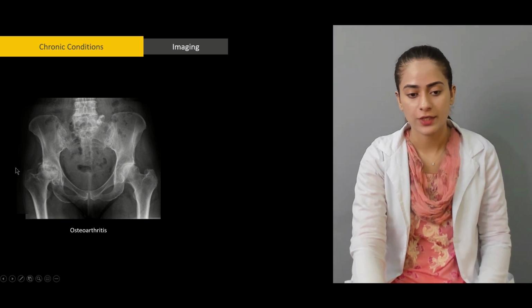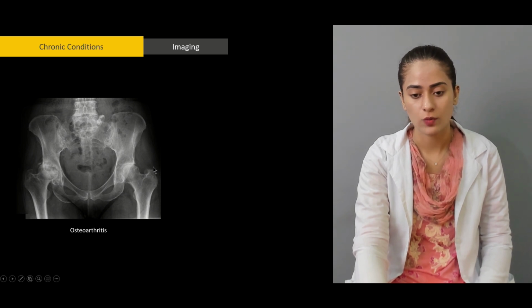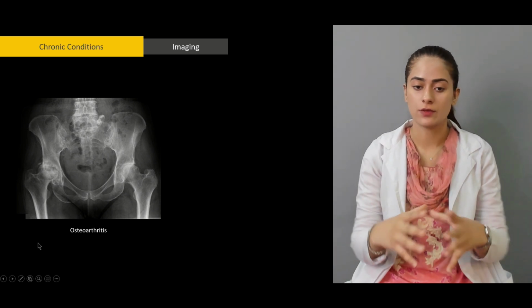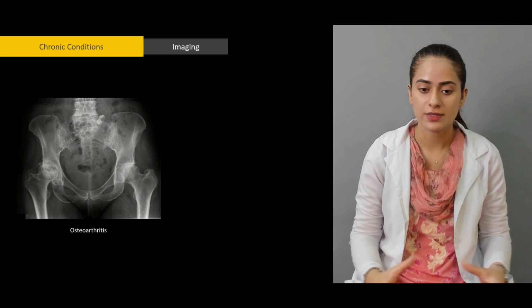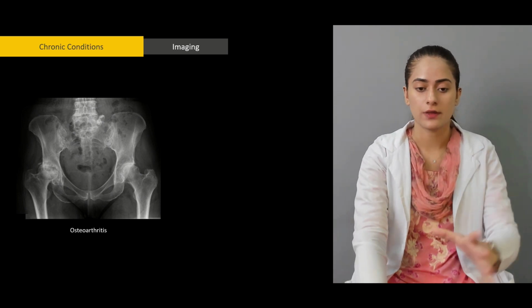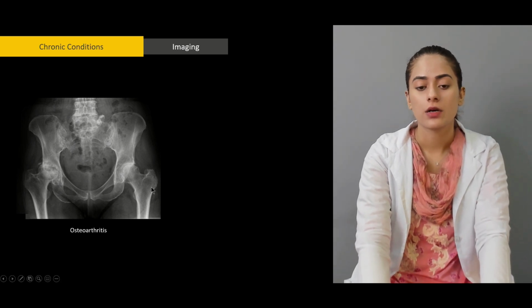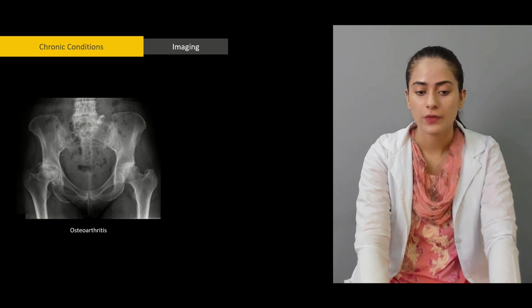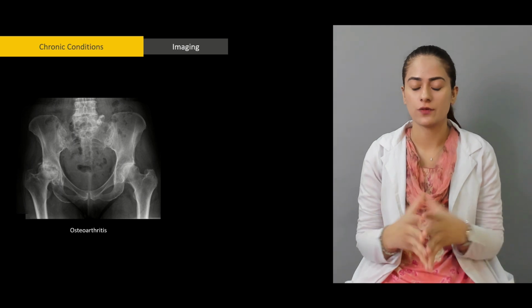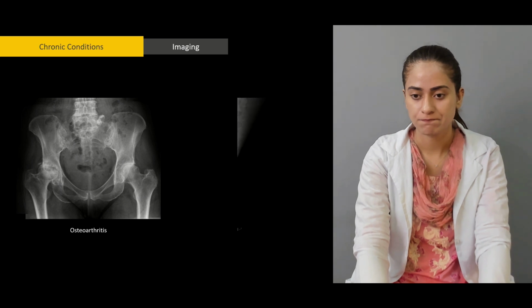So an osteophyte, we found this osteophyte here as well. So there is something happening here as well, this ossification here. So this is how osteoarthritis involves multiple joints and multiple bones of a person. Like we established, this is a female pelvis, and we actually saw all of the basic features of osteoarthritis on it as well. So this is an ideal OA radiograph.